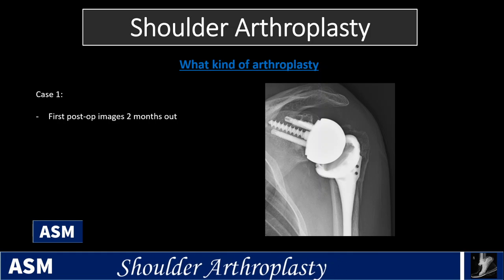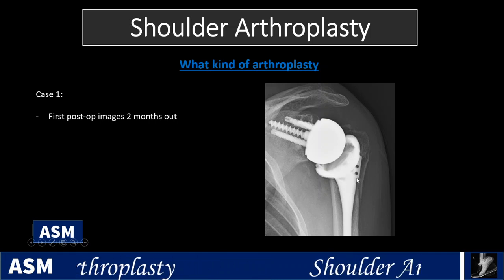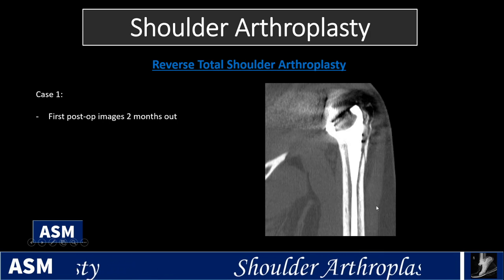This is the first post-op images 2 months out, and you can see that there is a periprosthetic fracture right here. The CT scan showing the same thing.